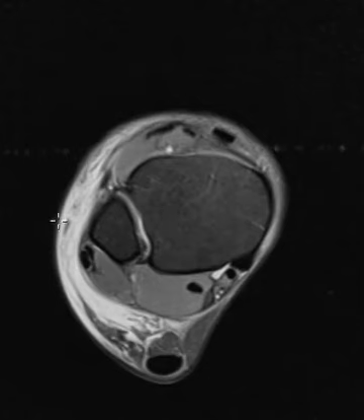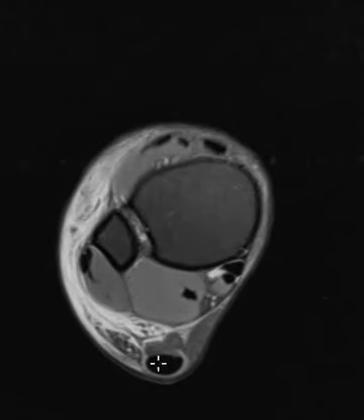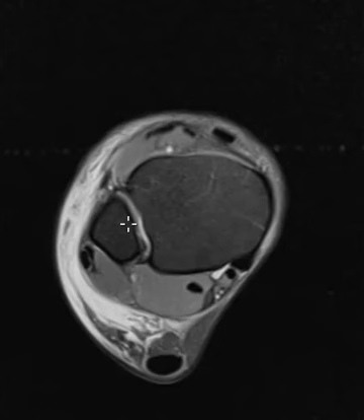They have lots of edema along the lateral ankle here. All this bright stuff is subcutaneous edema. Back here is Kager's fat pad. The Achilles tendon looks normal here. Now we're going to go down.